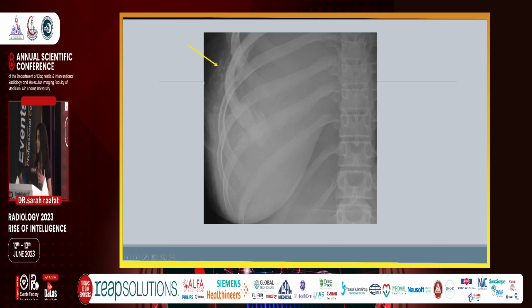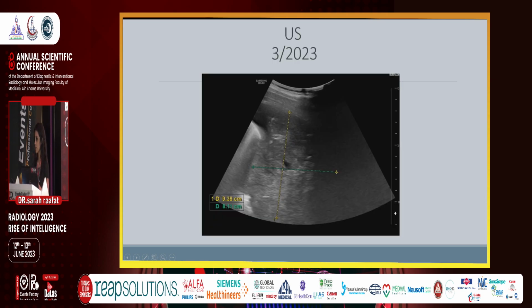Now, because as we say, the emergencies are the emergencies, the patient's respiratory distress was addressed first by having an ultrasound to assess if the patient can have a pigtail inserted. This is the ultrasound image. They're a little bit more difficult to look at. So, this is the lung shadow. That's the effusion. And that's our mass, soft tissue mass, inseparable from the chest wall.